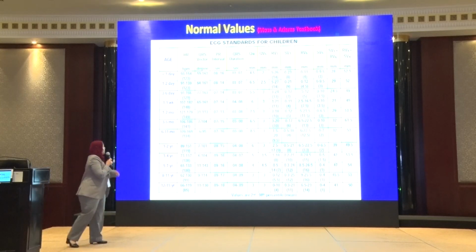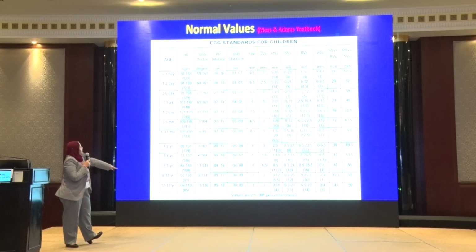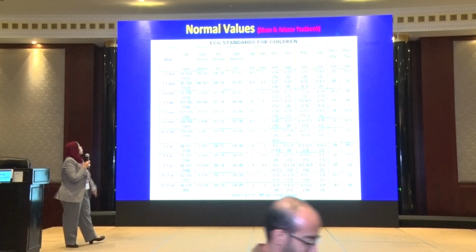So as we see here, the PR will increase with age. The QRS complex will increase also with age.